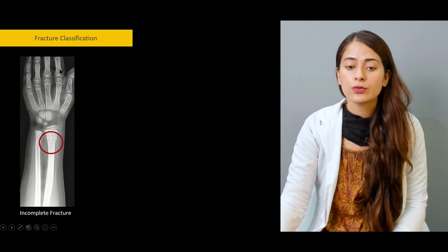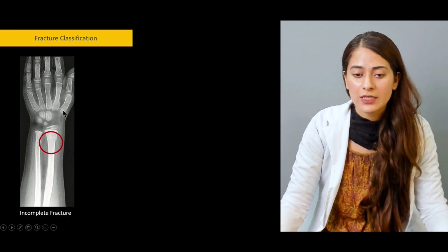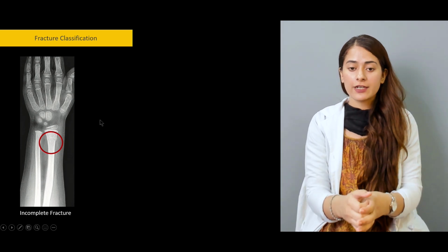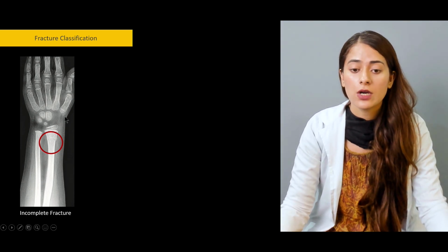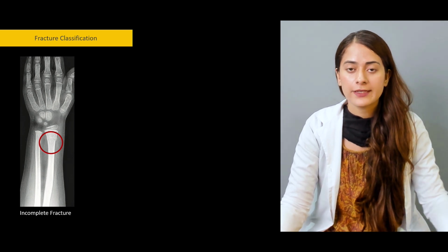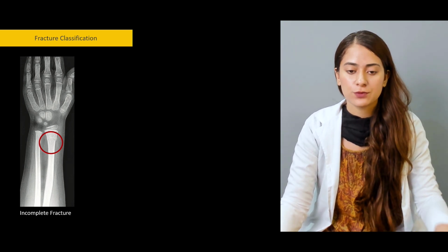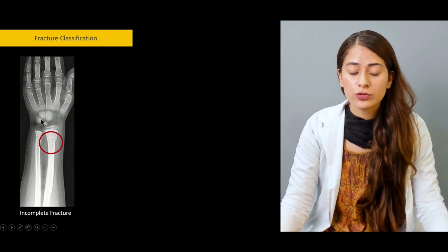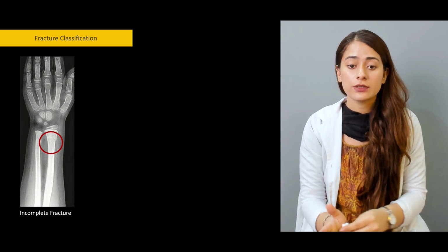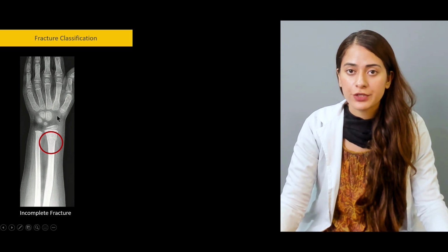Okay, so how do we know what the age of this individual is? The age is actually a determinant of the ossification of bones. There are specific age brackets given for every bone at which it is completely ossified. These carpal bones are not completely ossified and not completely bony on the birth of a child.